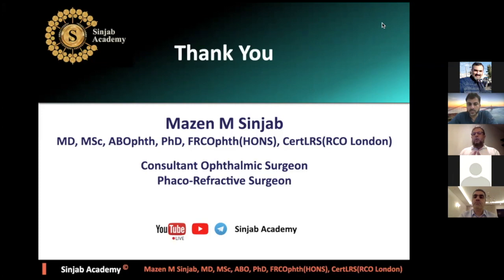Now, whether to go for wavefront guided or topography guided, there is a misconception amongst ophthalmologists. They think that if we go for corneal wavefront, we are treating wavefront. Actually, corneal wavefront is topography guided treatment, because it is based on elevation maps. The only real wavefront is the ocular wavefront. So either we go for ocular wavefront, or we are doing topography guided treatment.